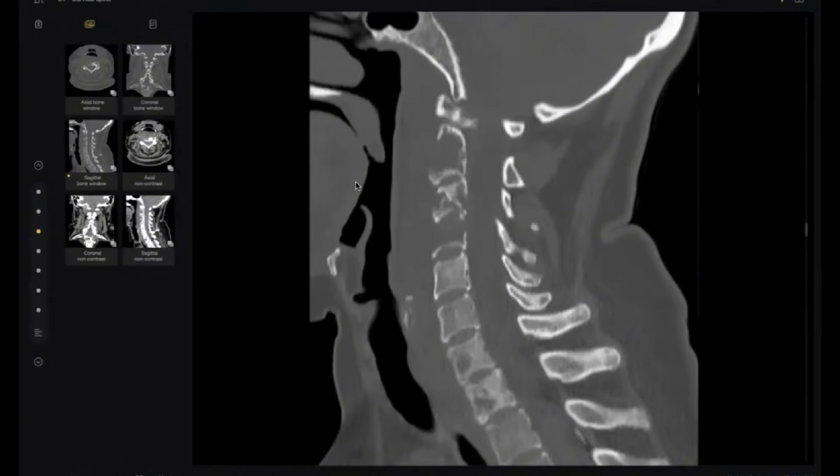So this is a cervical spine CT, sagittal, bone window. There is multi-level cervical vertebral body destruction with loss of congruity of the anterior cortex, most notable at C2, 3, and 4. Similar lesions are seen in the lower cervical vertebrae.